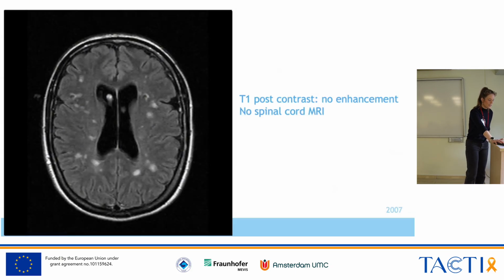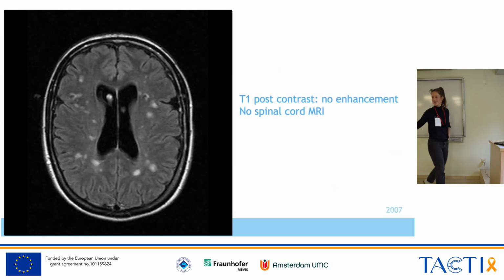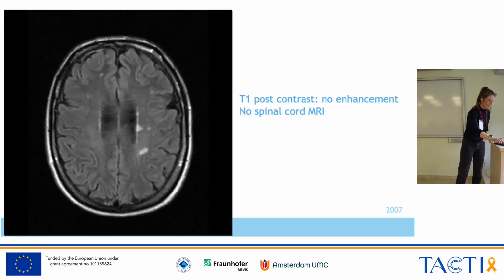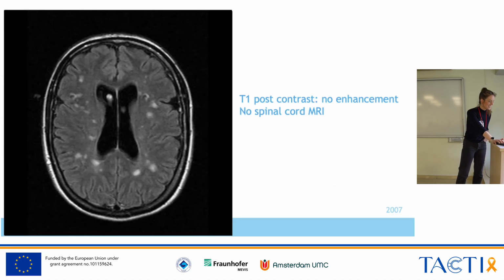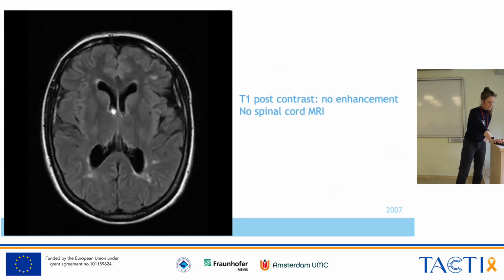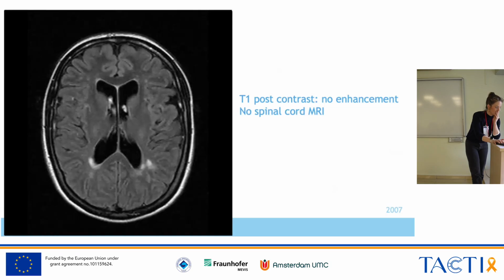So, and this is what happens, right? We ask the radiologist, here's a scan, you don't get any clinical information, good luck with it. Make difficult decisions and please tell me if it's MS or not. Is the size of ventricles normal? It's a bit enlarged, or at the upper limit. I agree. What you can also say is that her brain volume looks relatively normal, but there is variability between patients. So I must say she has quite some ventricles, but this is something that we see in quite a few patients.